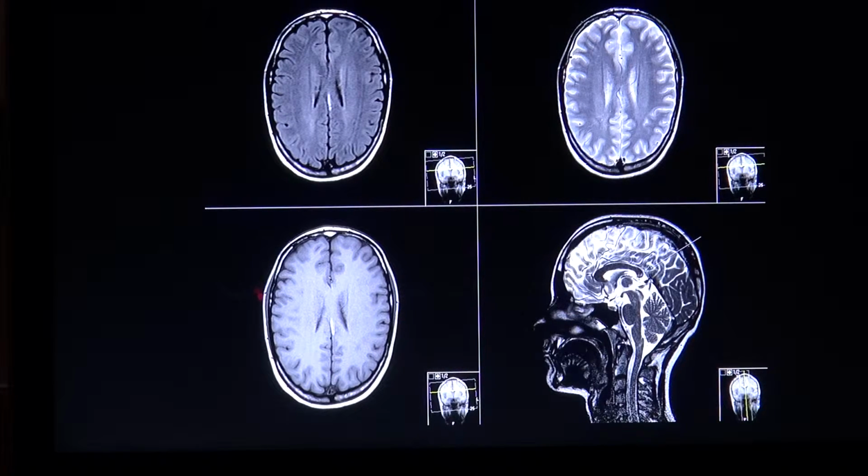In this video, I'm going to talk about the pericallosal lipoma. The pericallosal lipoma is a fat-containing lesion in the interhemispheric fissure of variable size. Although a rare lesion, it is still the most common location for an intracranial lipoma.